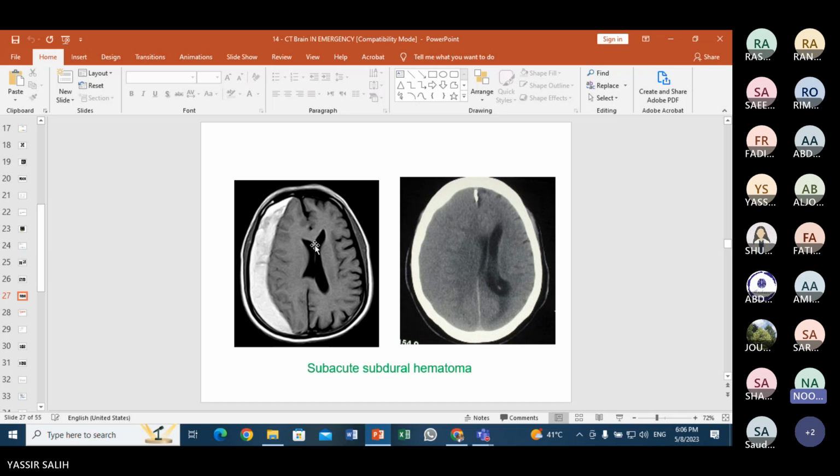Hyperintense. Concave hyperintensity, on the right side, and it is concave.